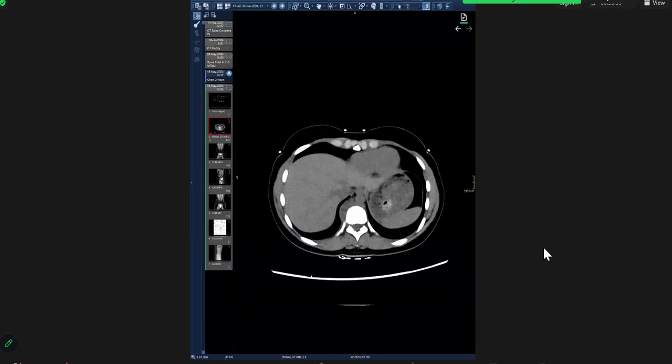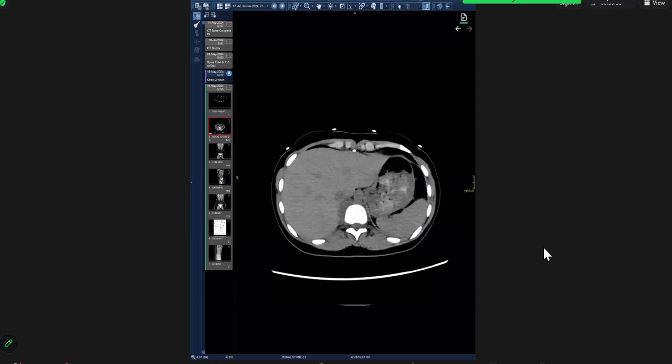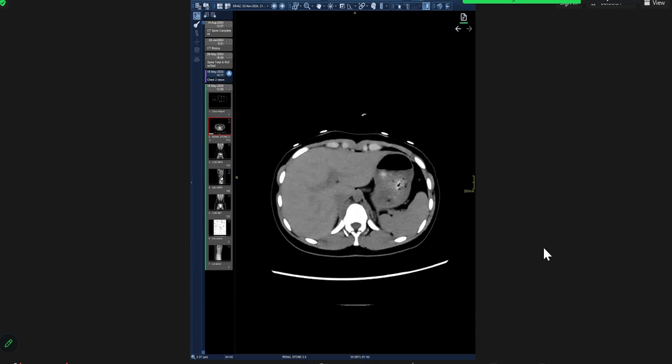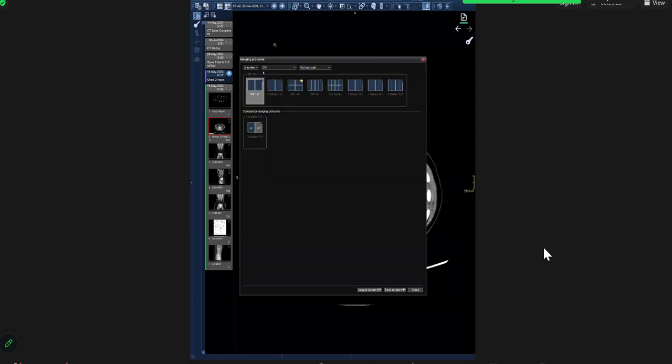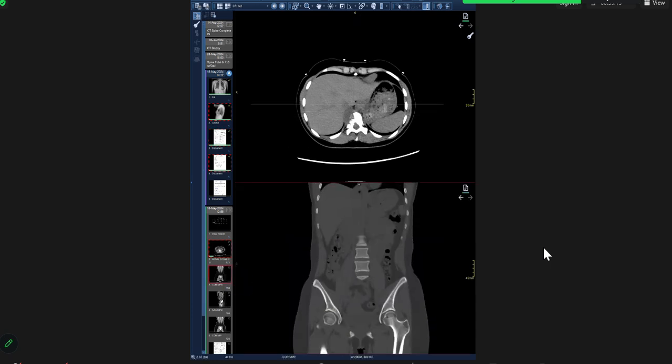Okay, so on CT scan plane examination, I can see a hypodense collection or soft tissue density along the right paravertebral region, which is causing erosion of the vertebral body. Yes, ma'am, I want to see the bone window for this.